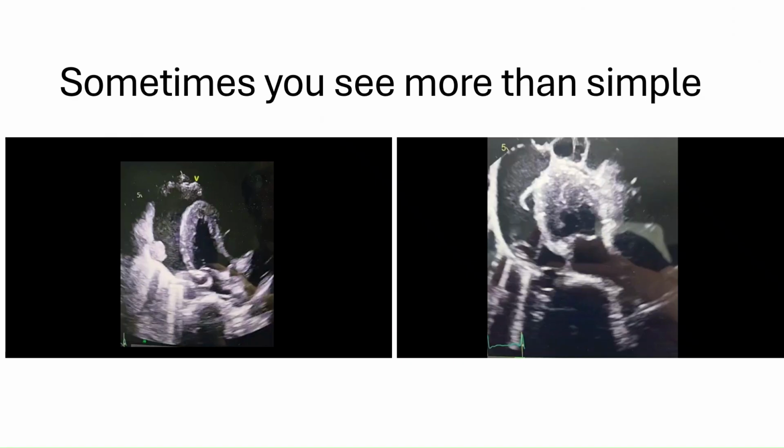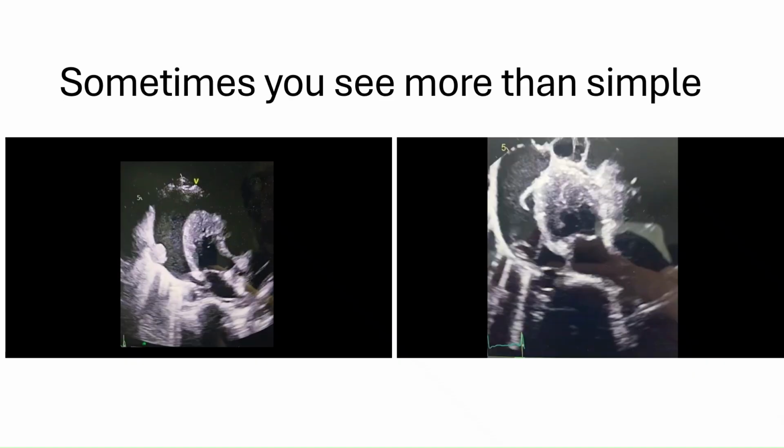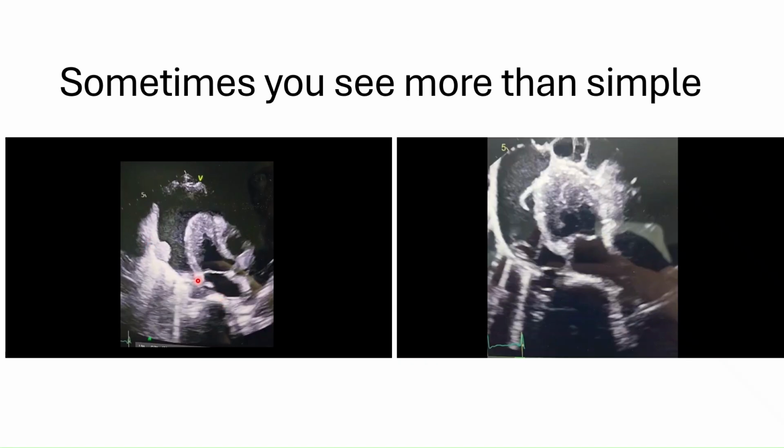Sometimes we can see more than just an effusion, right? So on these slides, you can see on the left, there's a big effusion, but there's some kind of mass, right? You can see here, there's a mass, so it's a metastatic lesion, and you can see as well here, a small mass, so probably this effusion comes from the malignancy, right? It's a metastatic lesion in your pericardium, so it's pretty obvious to see.